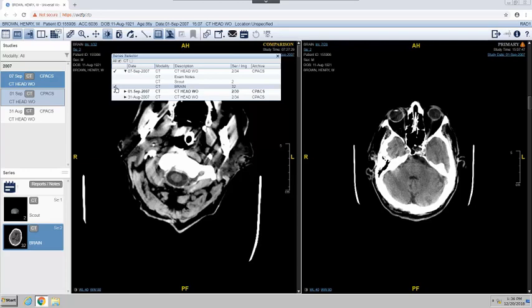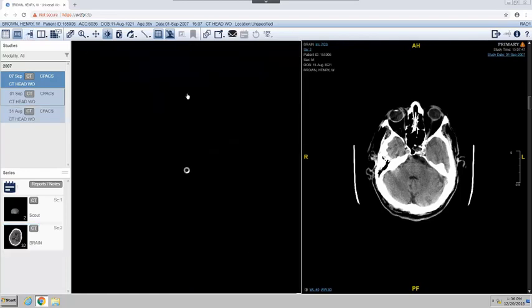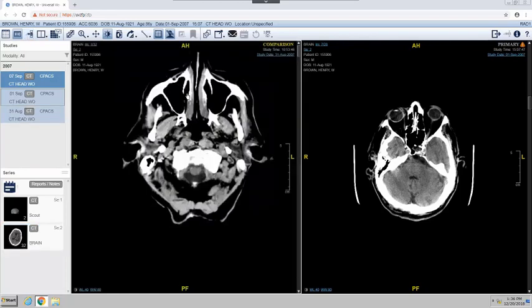To expand or collapse the tree view, select anywhere on a row to expand the study. The currently open study collapses, and only one study can be expanded in the series selector at a time. To open a series from an online study, select the study, then the row for the desired series. The images are then displayed in the active viewport.